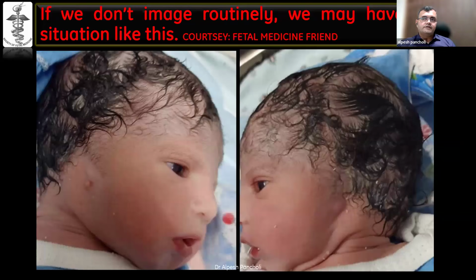But if we do not image ears routinely, we may have a situation like this. This was a case shared by a friend. Here, the anatomy was normal. There was no anomaly. The pregnancy was uneventful, but at birth, there was bilateral anotia.